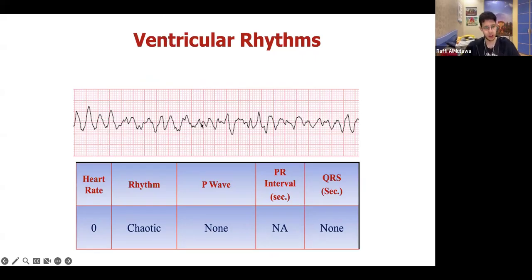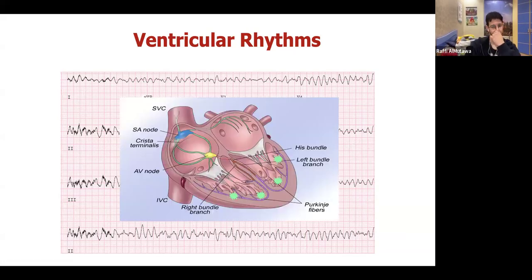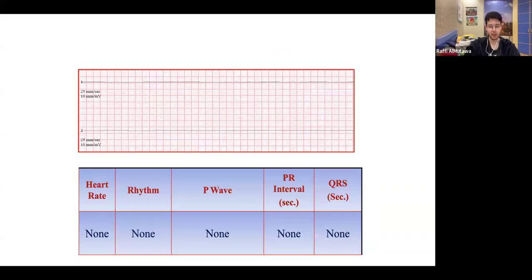Absolutely. Why is this ventricular fibrillation? As you guys can see, it looks like the word fibrillation. Therefore, it says fibrillation. But the QRSs are wide. There is no narrow QRSs. You can't even tell where anything is in this case. There's nothing identifiable about it, absolutely. And it's not a flat line. So we call this ventricular fibrillation. And this over here is another picture of ventricular fibrillation. This is an emergency. You see fibrillation, you defibrillate. Monkey see, monkey do. I don't know why I have this thing with the monkeys, honestly.